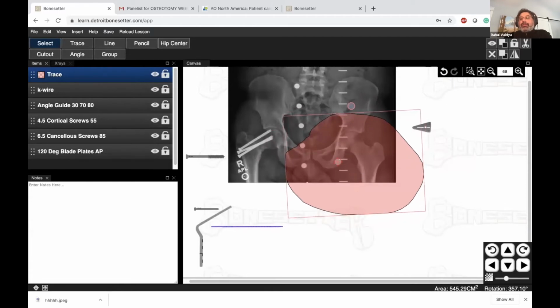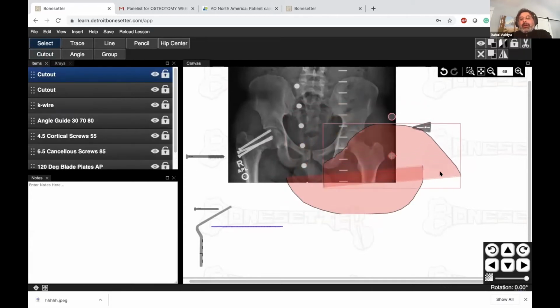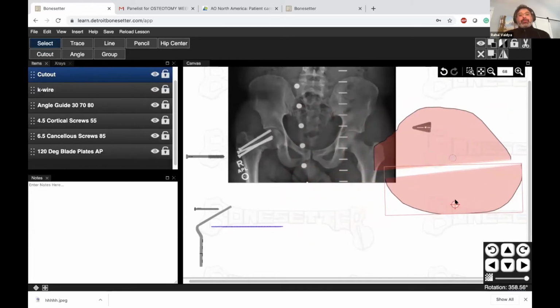Again, I'm going to show you the cut tool. If you cut a piece in half, you can make that line and cut it into 2 pieces. Then they become 2 separate pieces, and you can now rotate and put the center of rotation on either side. Can you show the grouping tool again? Yeah, there was just a glitch with the grouping tool. I'm trying to ignore that.